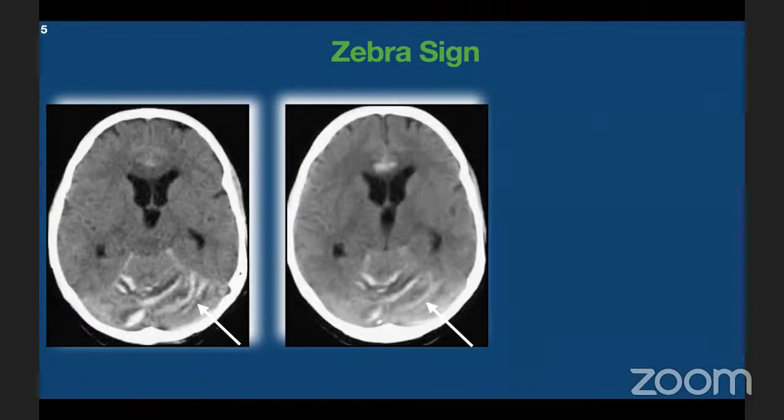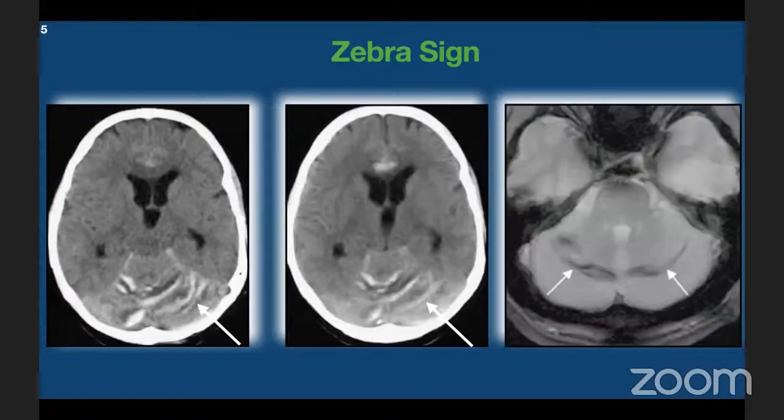Remote cerebellar hemorrhage is a rare but benign complication of supratentorial craniotomies. Initially, the patient had mild gait disturbances, but returned to normal after 4 months. MRI after 3 months shows bilateral superficial siderosis on the folial surface. The exact cause of remote cerebellar hemorrhage is not known.